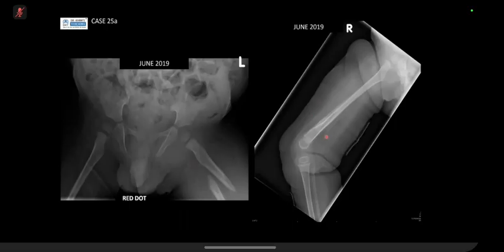There's a periosteal reaction, a lamellated type of periosteal reaction in the visualized femur. Okay. And then how about the left hip or the left leg? This is the left leg. Okay, there's a fracture of the left femur, which is an old fracture because there are corticated margins along with the periosteal reaction, and there's evidence of soft tissue around that.